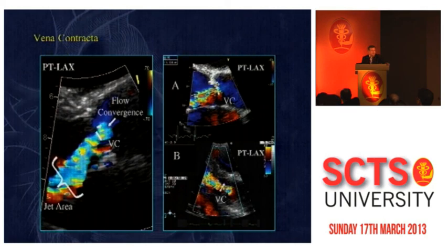A bit more tricky in patients with a prolapse. This is a bicuspid prolapse. You see that the orifice is probably lying in that direction. So we made the cut plane in that direction to see an en face view of the regurgitant orifice, and you can then make the planimetry of it. This is a type 2 dysfunction. This is a type 2 dysfunction as well, but in a tricuspid configuration. And you can beautifully see the prolapse that is seen at that level, and then we make the plane cutting almost perpendicular to the aortic plane to get a beautiful view of the regurgitant orifice.